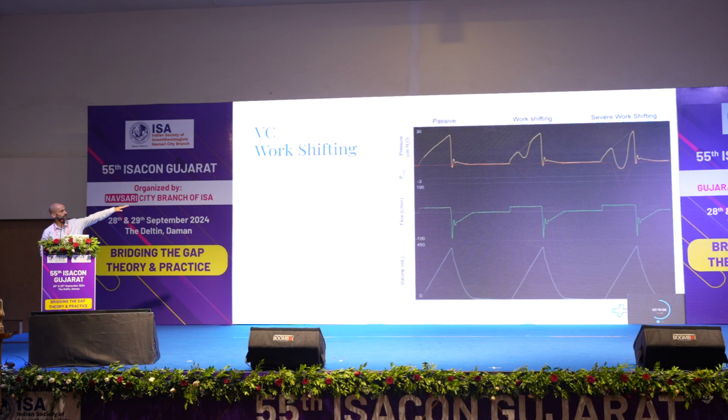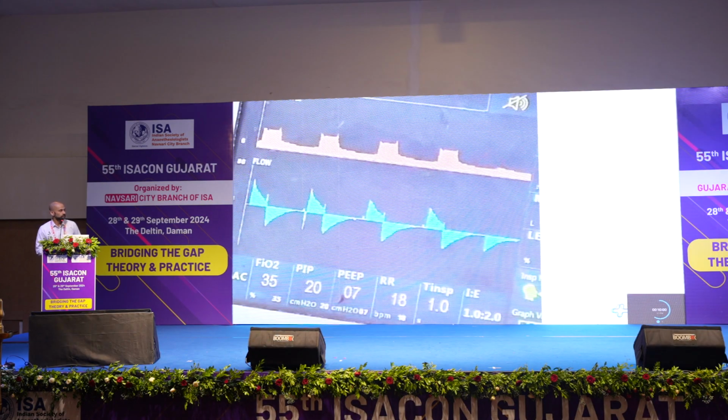And severe is when that pressure line crosses the baseline, and it can cause lung injury by the way. So here's a practice session. What mode is this? Is it pressure control or volume control? There are no labels here. You just need to look at the waveform and guess.